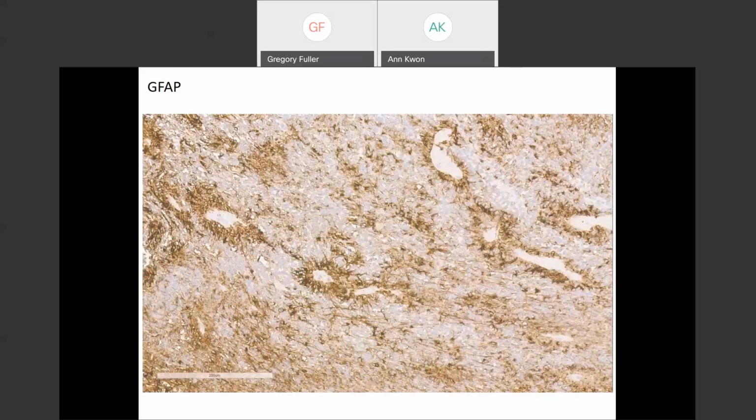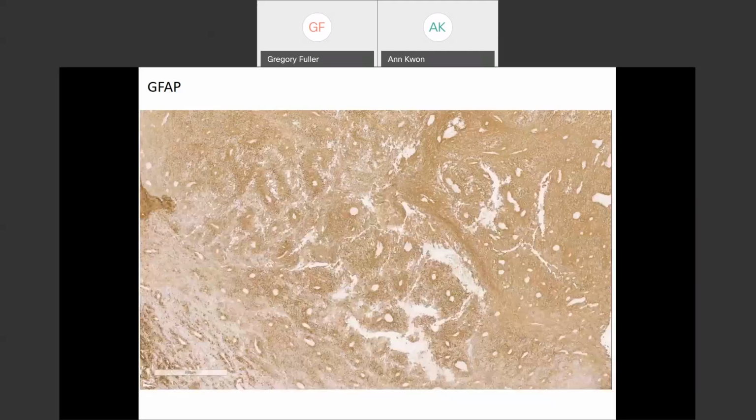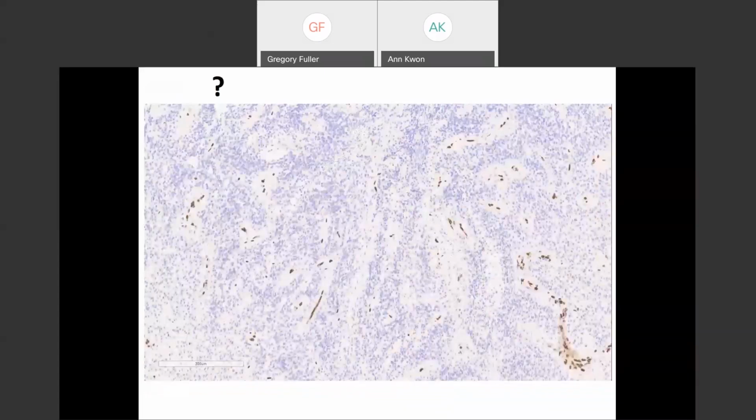You can see the accentuation around the blood vessels. In other areas, look at this, it was almost solid. It's quite variable. Sometimes it's almost negative. And here's your next quiz question. What's the antibody? ERG? Okay. Yes, Sergio Pina-Oviedo, ERG. CD34, ERG and CD34, CD34 from Dr. Harb.